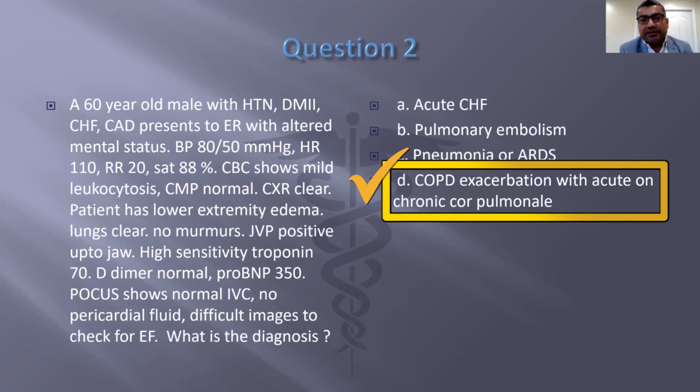If you do the SVC ultrasound, you may see a dilated SVC all the time with the JVD. But the IVC could make you figure out if there is hypovolemia. So a COPD patient can be severely dehydrated, and the IVC would be small. At the same time, because of the accessory muscle use and the lung issues, they may have JVD all the time with SVC dilatation.